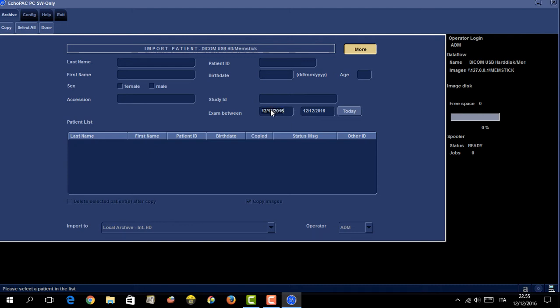Type the correct date. The exams will appear.